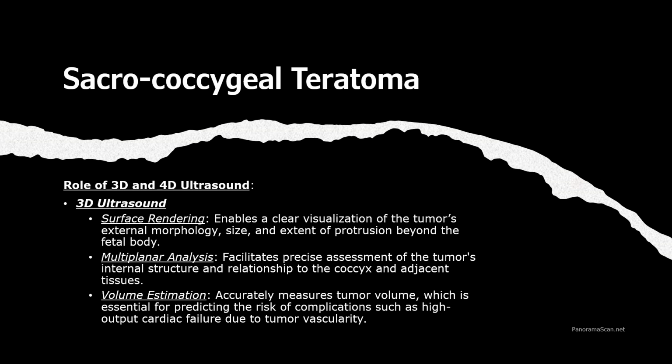Volume estimation is another essential feature, enabling accurate measurement of the tumor's volume. This is crucial for predicting risks such as the development of high output cardiac failure due to increased vascularity of the tumor that overloads the heart.